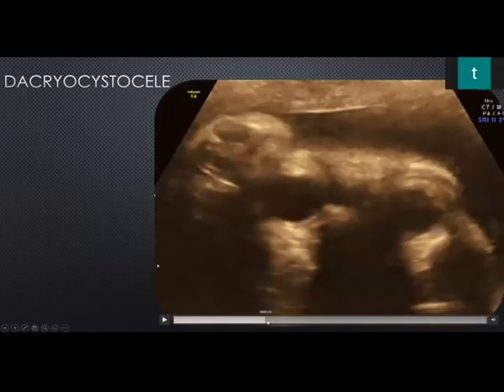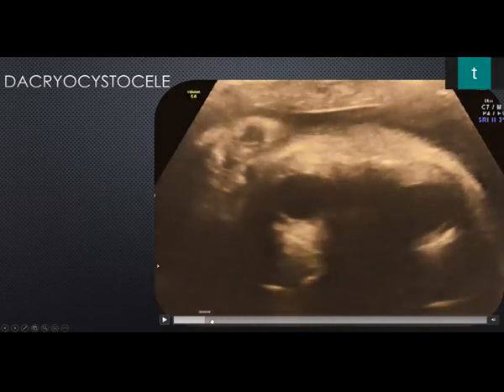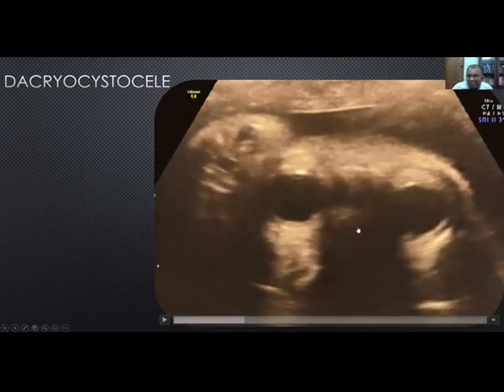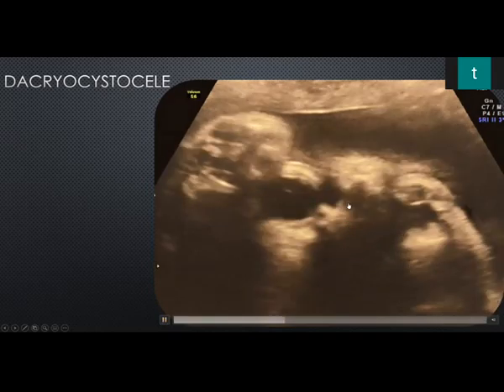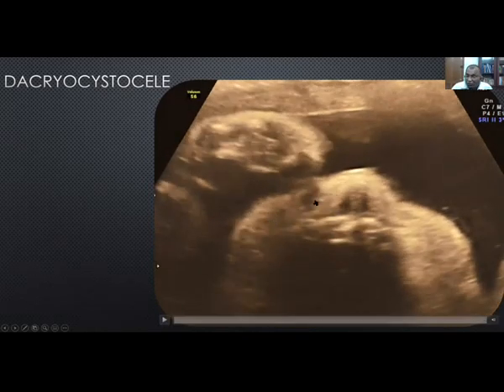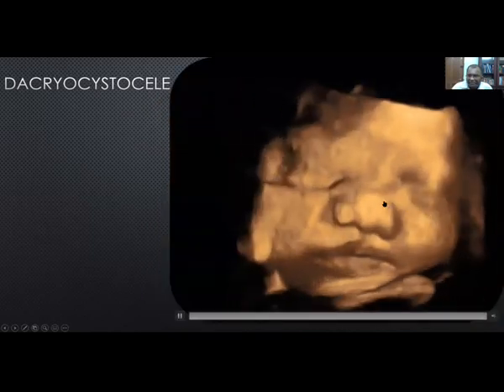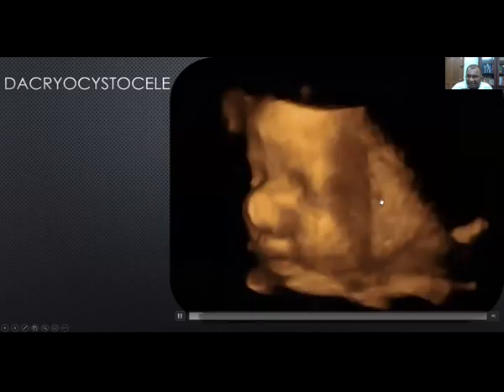So usually frontal encephalocele is associated with hypertelorism. That you need to seek and rule out. And if you think the orbits are normal and the cystic space appears normal, especially if it is towards the medial canthus, it is dacryocystocele, and it has an excellent prognosis. 20% of them can be bilateral. Of course, it can be seen even on the 3D images.